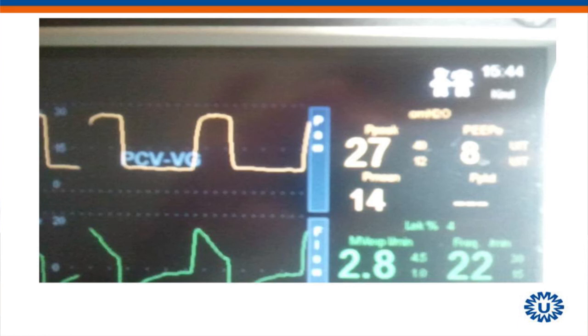What can we tell about it? No, I don't think there's any leakage. What is the pressure in the lungs of the patient? Is it the peak pressure, or the plateau pressure? The peak pressure includes the resistive part of the curve, maybe due to a smaller tube or water in your system or anything else.